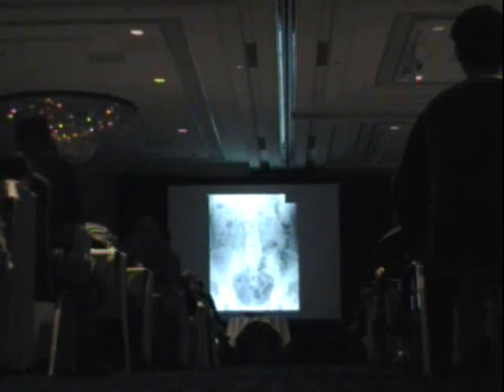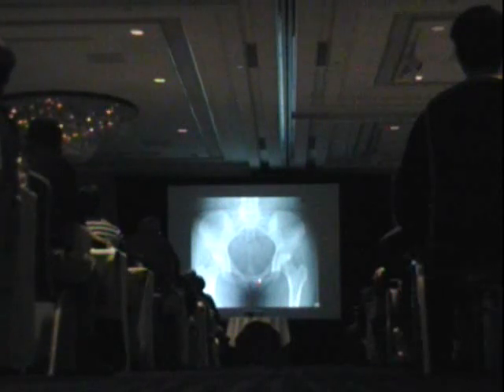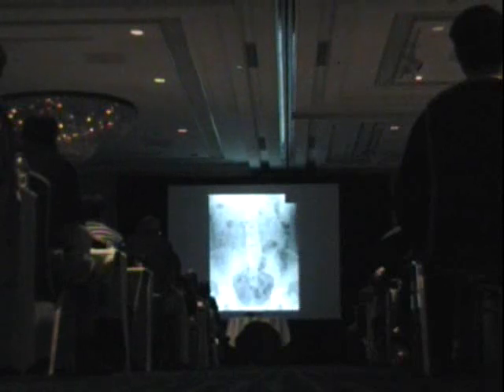Now, another thing that I want to bring up is that, on that last image, the gynecologist who ordered the plain film up in the clinic ordered an AP pelvis. And the radiologists here know that the IUD is never going to be below the pubic symphysis, right? So all this stuff we don't really need. But you know what? We're lucky we caught that one. That easily could have been ripped off the top of that AP pelvis and we wouldn't have seen it at all. So this is that image to get. And if it wasn't here, we'd almost need to go higher, because you need the diaphragm to the pubic symphysis if you're looking for a lost IUD.